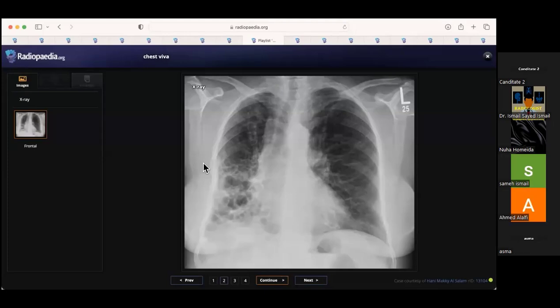Bronchiectatic changes of the right lung is in the differential. So I will compare these images with prior ones, if any are available, to assess the chronicity and the progression of the disease. If there are no better images, I will proceed with the CT scan for further evaluation.